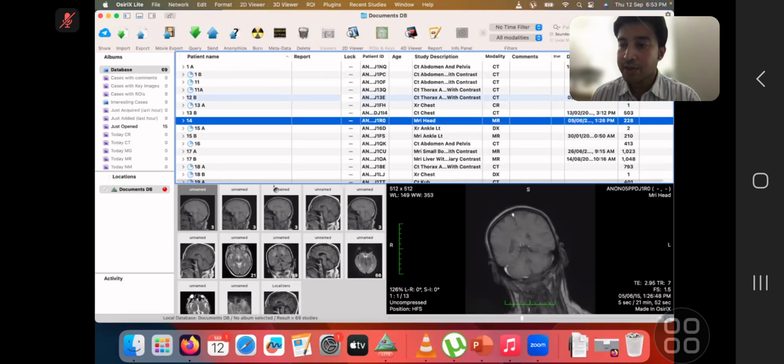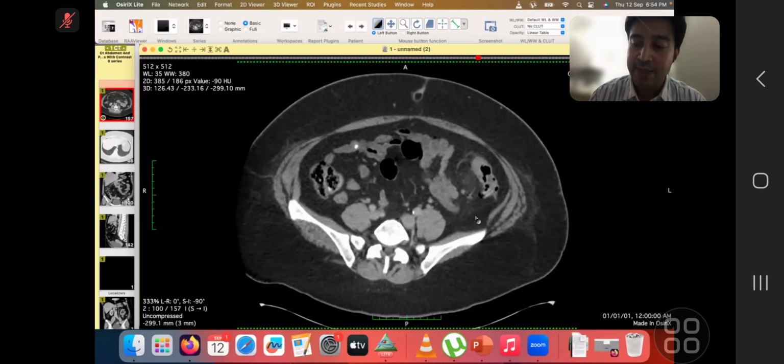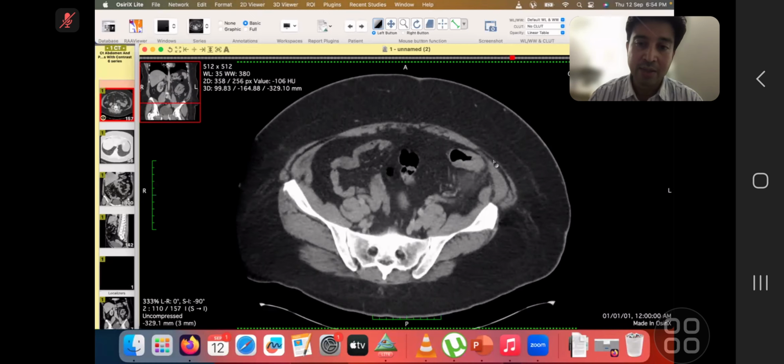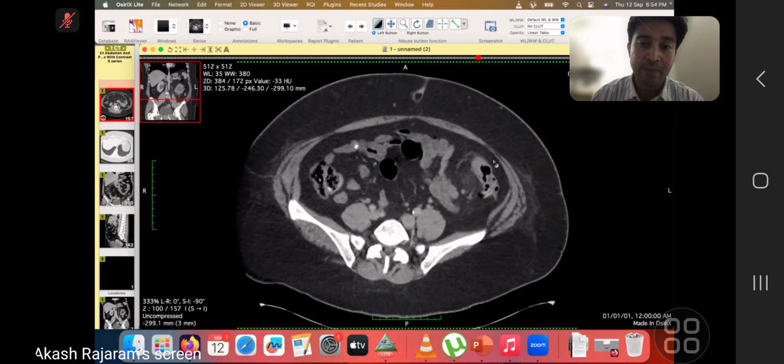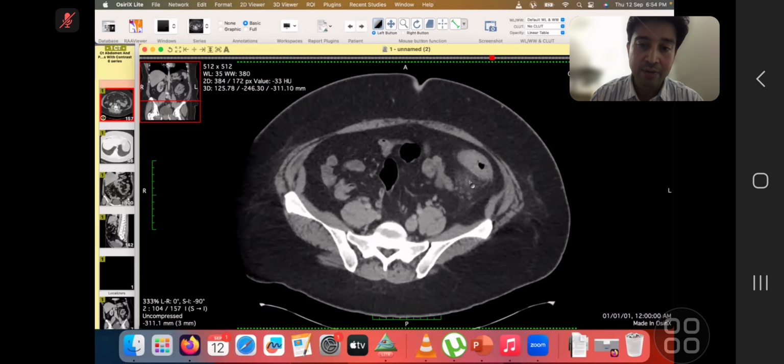So this case you did extremely well. I think you did really well. But let me just add to what you had already mentioned. The patient, as I mentioned, was having raised inflammatory markers and had come with pain. And you mentioned anyone would have thought that this is diverticular disease initially, but you should always remember that you can see this fat stranding over here.